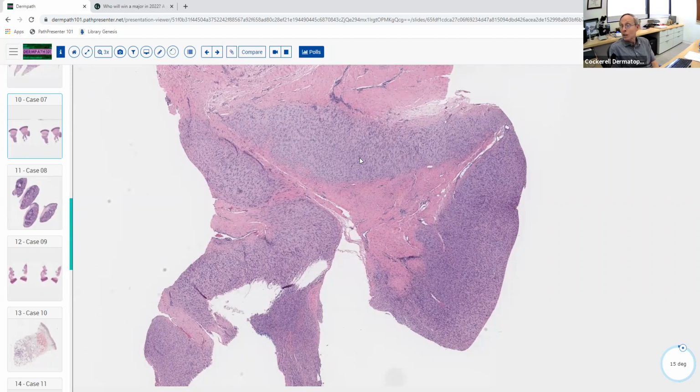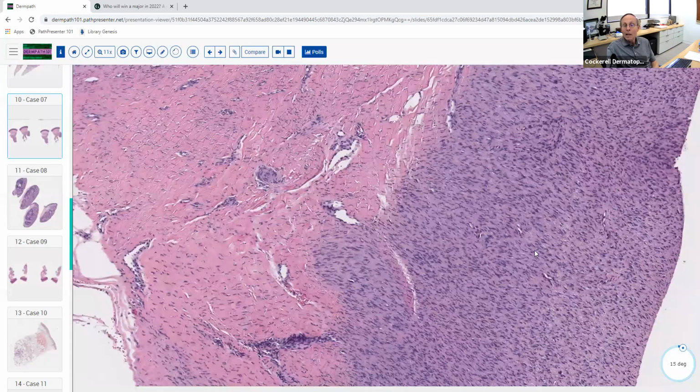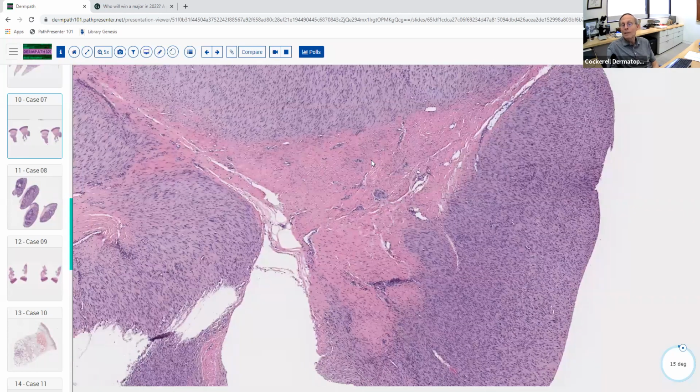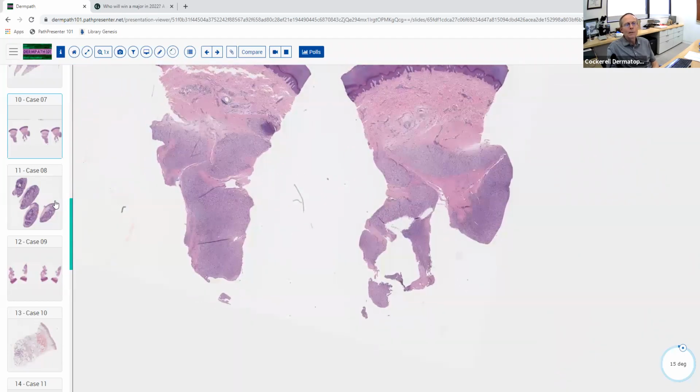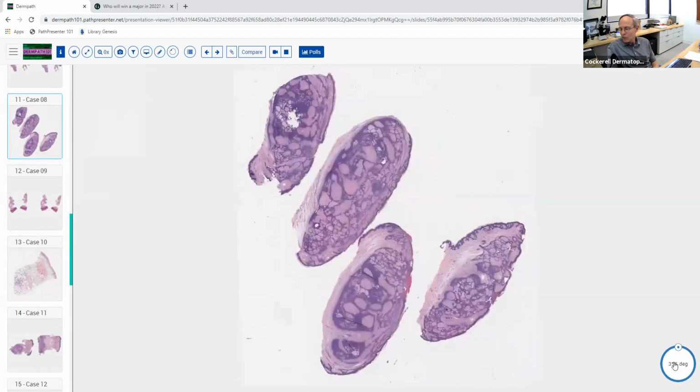You can get giant cell tumor of tendon sheath, fibroma of tendon sheath. That's in the family of the fibromatoses. Torticollis, Peyronie's disease. Those are all in the same family of entities, and if you do a biopsy of them, they all look just like this. They all have similar morphology. If you get giant cell tumor of tendon sheath, you'll see large osteoclast-like cells and osteoblast-like cells. But they all generally look like this. So that's good that you were able to get that diagnosis. It might show you something like this on the board. Not going to promise they will, but at least if they do, it's fairly straightforward.